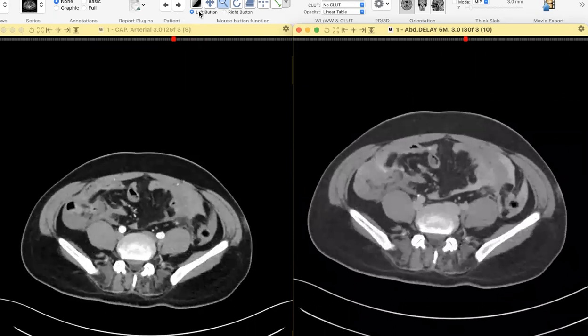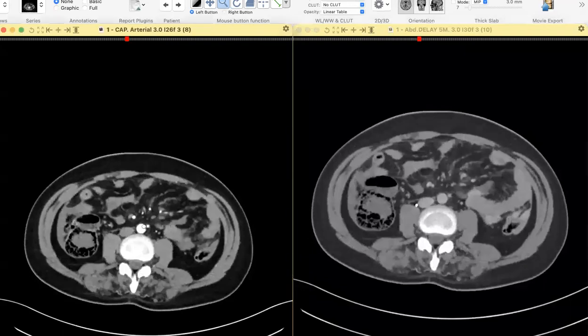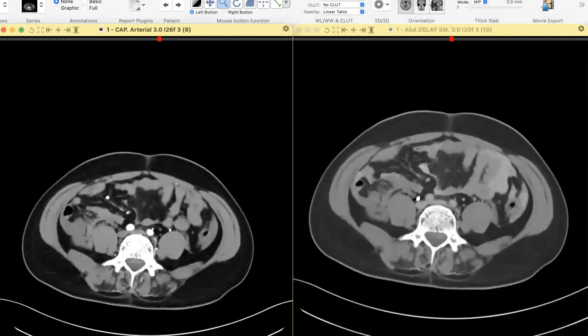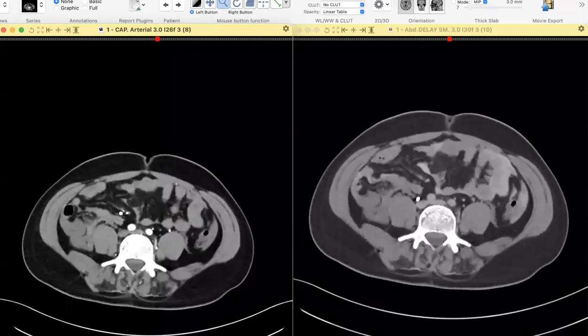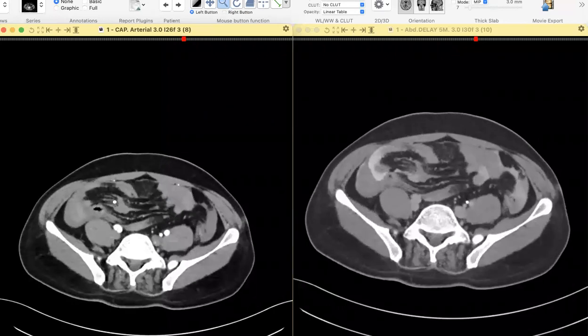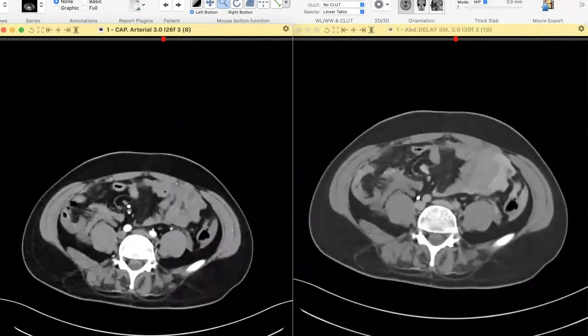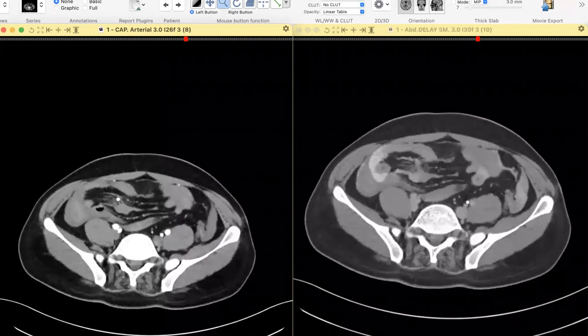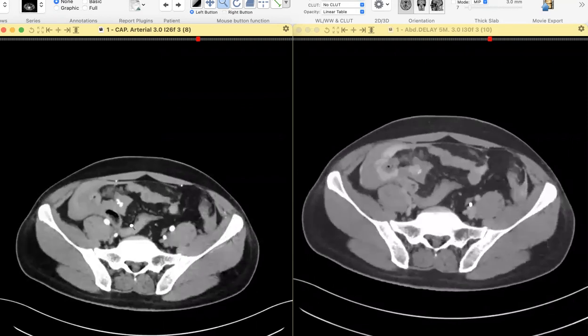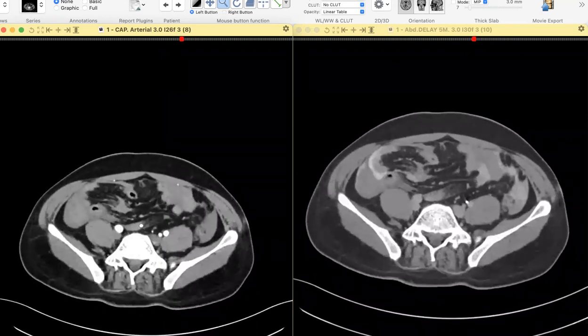So, thank you very much. Dr. Wasif, can you please point out again how this is the branch of the superior mesenteric? Sure. So if you just follow the superior mesenteric artery, it's going this side, right? And then you have certain branches. This is a branch, this is a branch. And I was tracing the wrong branch, but the anterior branch, and there's a blush. You don't necessarily have to trace the complete artery, but all of these are superior mesenteric artery branches.